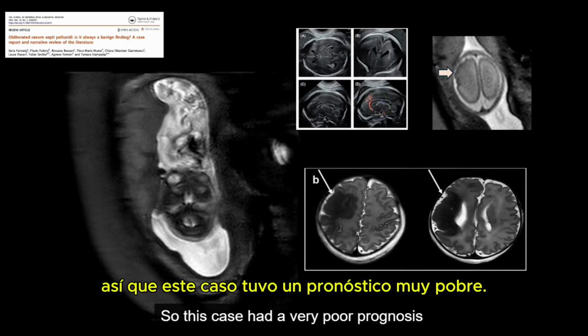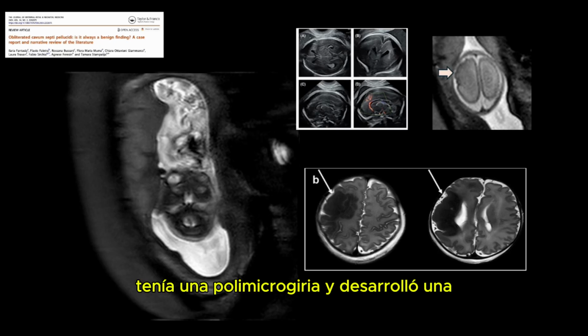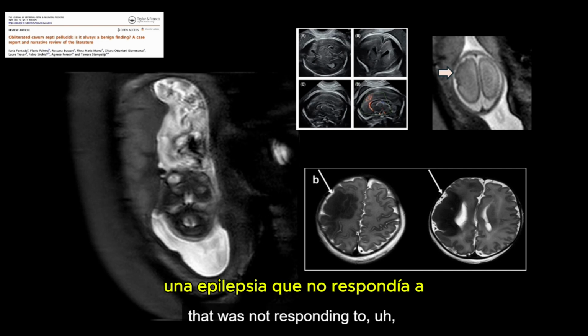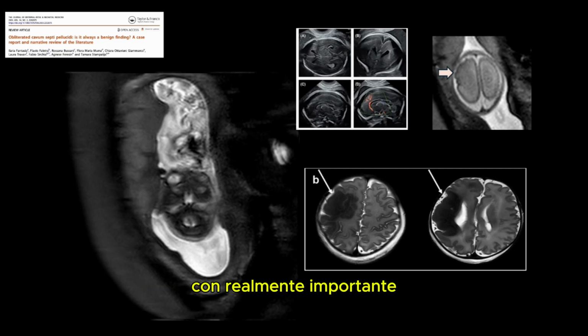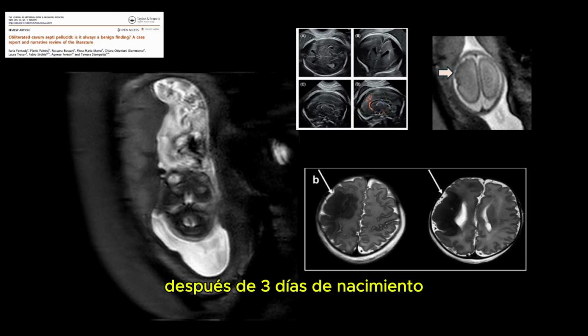So this case had a very poor prognosis because this neonate had a polymicrogyria and developed an epilepsy that was not responding to triple pharmacological therapy. You can see the MRI in the postnatal period with some really important brain bleeding, and this baby died after 3 days of birth.